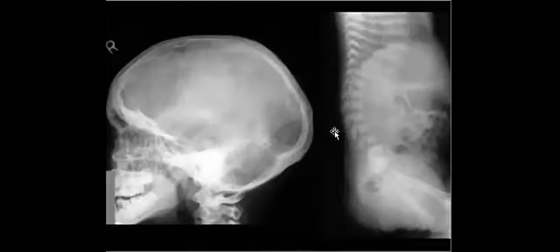What about the lumbar spine? What do you see in the lumbar spine? The look of sickle cell anemia or thalassemia? The same patient, anterior beaking, about achondroplasia, just to revise the criteria. So like a bullet, right? Bullet vertebra, perfect. Bullet shaped.